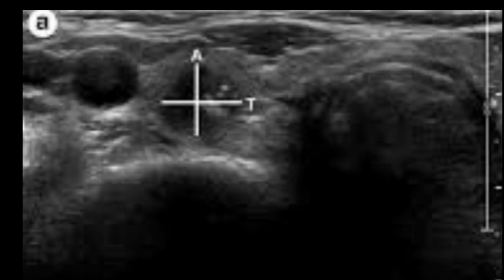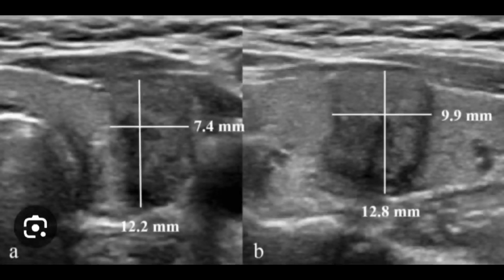Therefore pay attention to the size and also to the shape and anterior posterior length of a nodule, because it will clarify its malignant potential. To make your eyes more aware of the phenomena of tallness and wideness, here is another example which explains it beautifully, and measurement has also been given for better understanding.